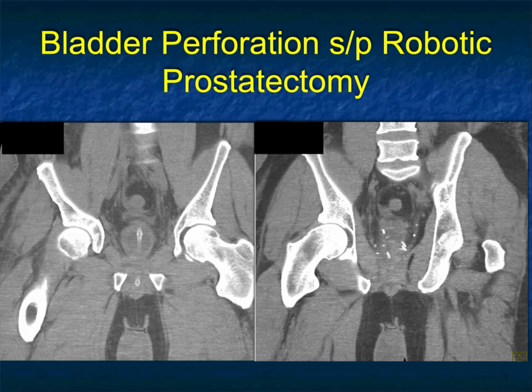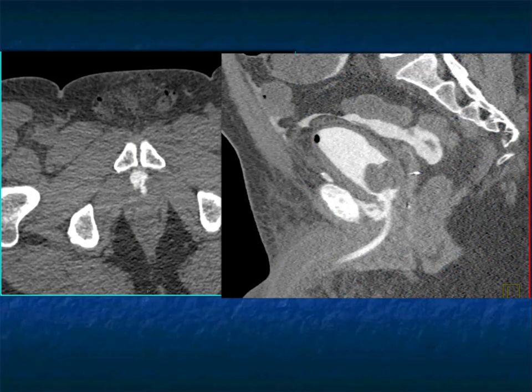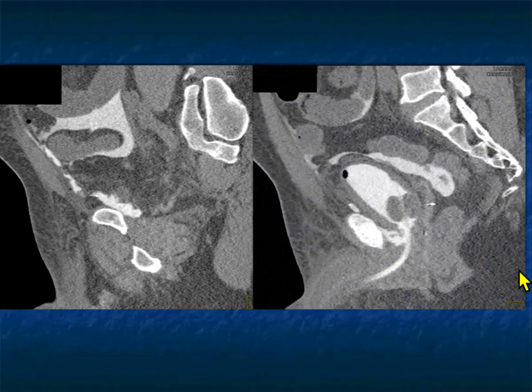And another example, kind of trauma, a patient post-robotic prostatectomy. They worried about the bladder. There's a Foley catheter in place. Kind of looks okay, but you give contrast, and the classic thing post-prostatectomy is a leak at the base of the bladder where the prostatic urethra was, and you can see the leak very nicely there, and then you get more images, and you can see the leak increases, and then you can see this contrast going intraperitoneal.